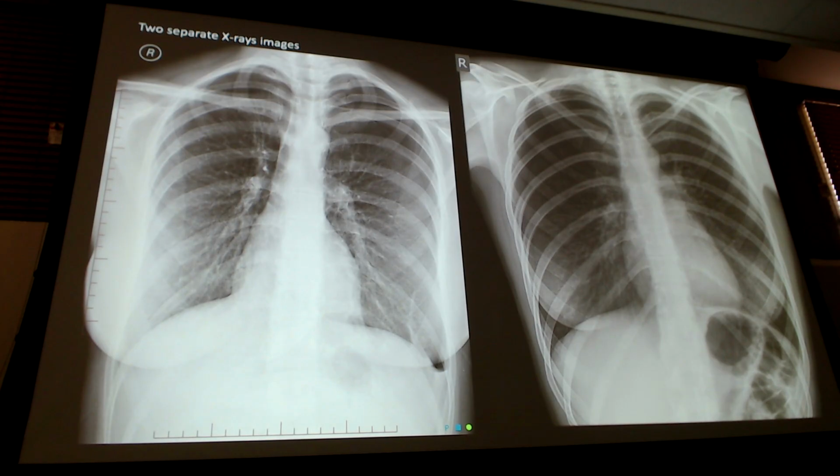But what really clarifies it for me is that I follow the scapula. I see the outer part of the scapula here, and I trace it down, up and over. Like when we did the MSK stuff, you trace your cortex. If I can trace the full scapula, and it looks the way a scapula is supposed to look, that's how I recognize that it's a scapular edge. So I do the tracing first, and then confirm it with lung markings superimposed, to go, oh yeah, that's my scapular edge line. Yes, sir.